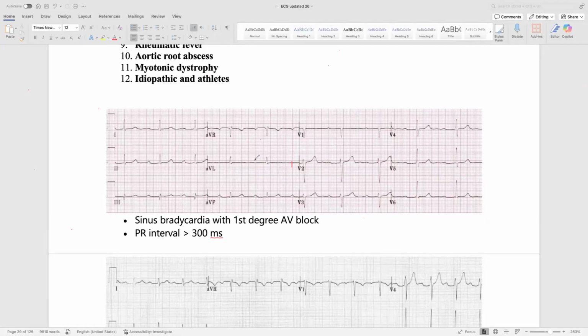There is faint. Sometimes in some leads, the P wave will be very small, naturally in AVL. The best places to see the P wave are leads 1, 2 and AVF.